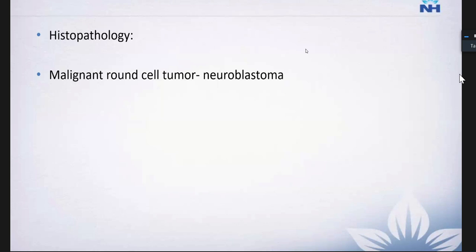or sometimes you will see very focal areas of subcortical, very tiny signals, which we usually mention as UBOs when they are not correlating with the clinical findings. But usually when the lesions are very patchy or confluent, and they are not myelination appropriate, then those are abnormal findings. They should not be reported as UBOs, right? So I'm not able to clearly understand what kind of lesions you are talking about, but I hope this gives some clarity to your question.